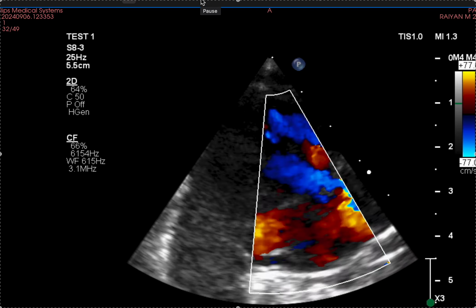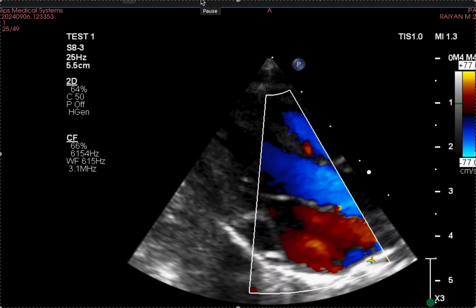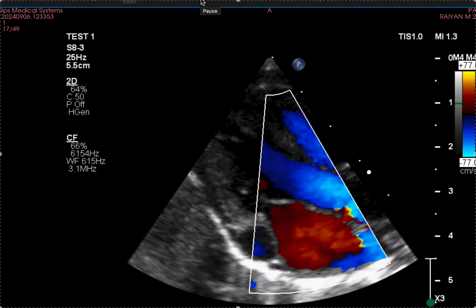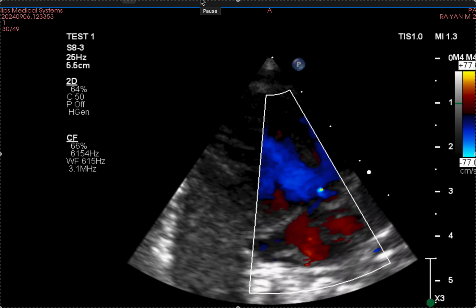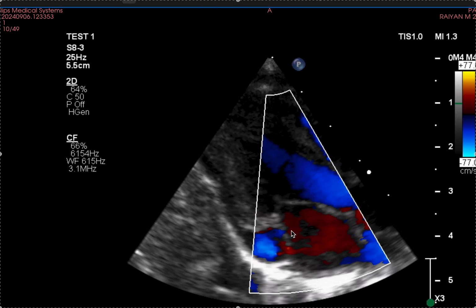Dilated coronary sinus due to drainage of left-sided superior vena cava. So this is a physiological condition. You will not find any chamber enlargement or any clinical symptom from the patient side. The only thing you will find is a severely dilated coronary sinus.